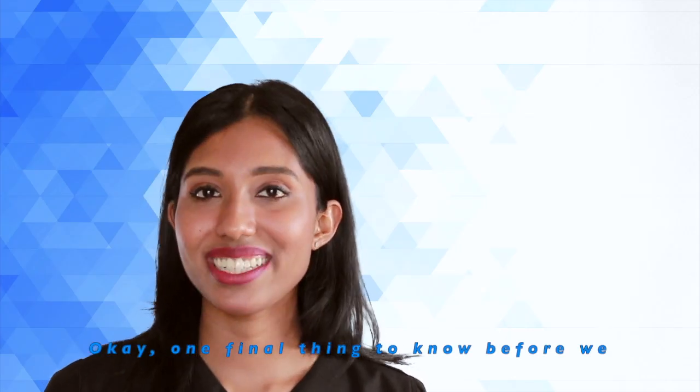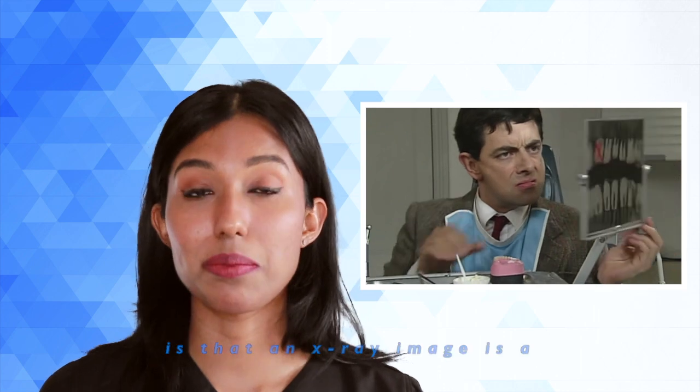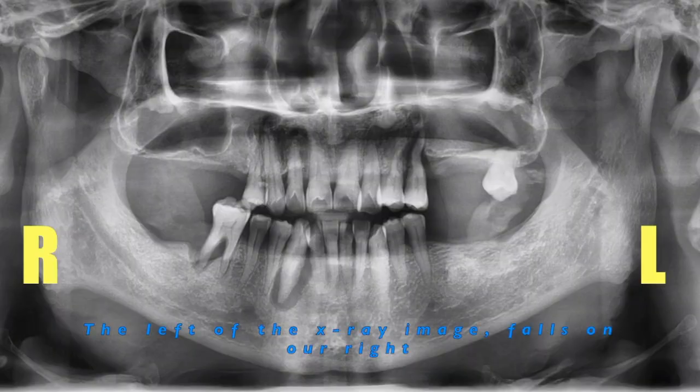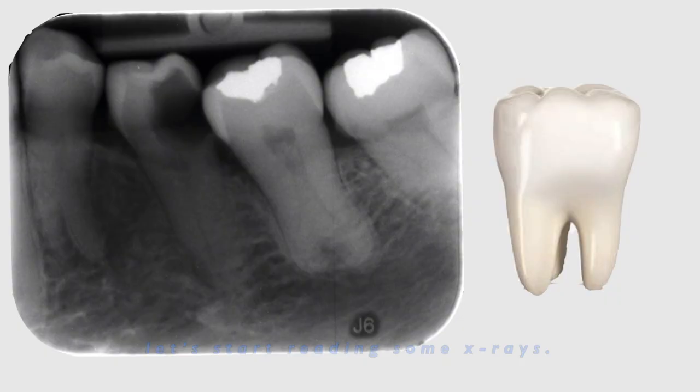Okay, one final thing to know before we start reading an x-ray is that an x-ray image is a mirror image of our mouth. That means it's inverted. The left of the x-ray image falls on our right and the right of the image falls on our left. Alright, now that we know some basics, let's start reading some x-rays.